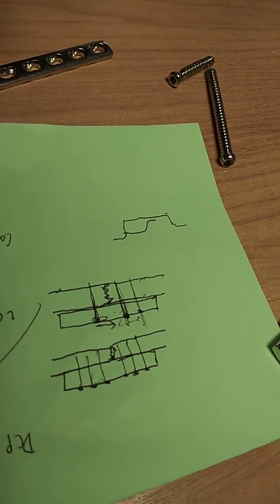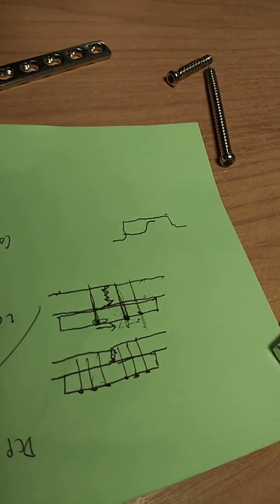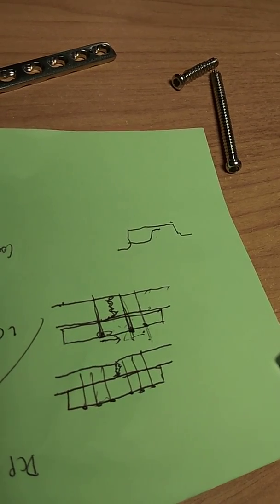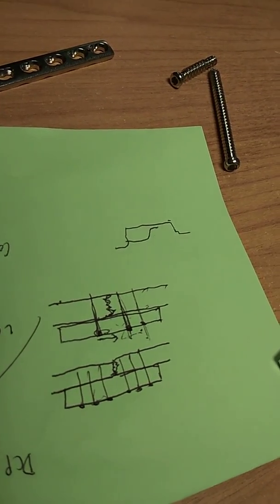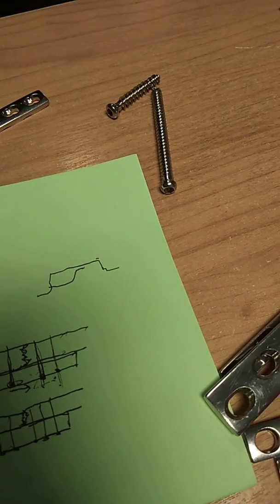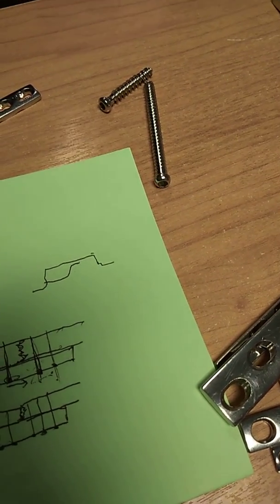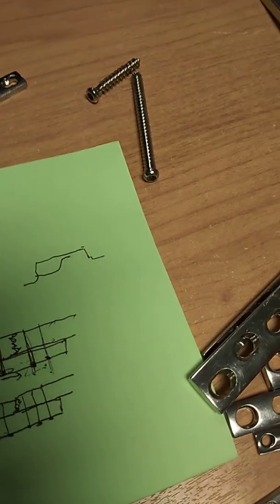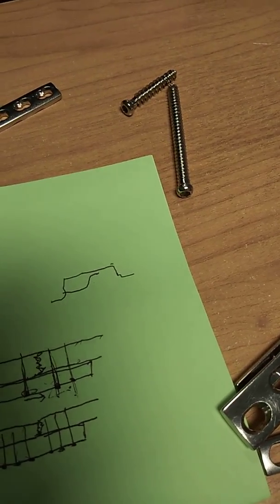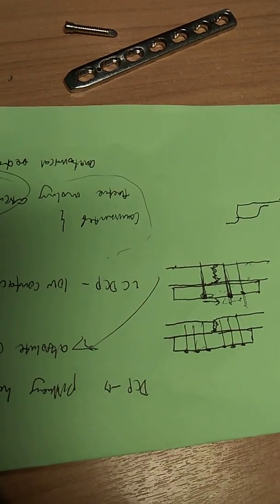So what are these holes on the locking plate? Extra small holes here that you see. What are they for? As I mentioned earlier, locking plate is used for comminuted fractures and also intra-articular fractures. So this one you're using for distal. Yes, you have to use K wires to splint the fractures before you place the screw. Okay, that is the function of these small holes.